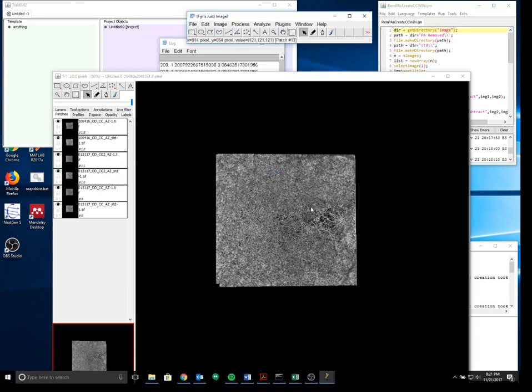And so the way this is working, it's looking for major landmarks among all the pictures, and it's going to align them based off of that. So you'll see it wiggled a little bit. And so now the next step is you're going to click this eye over here, and you're going to deselect every single one except for one. Next thing we're going to do is get this rectangle tool up here, and then you're going to form a rectangle to encompass as much of the image as possible.